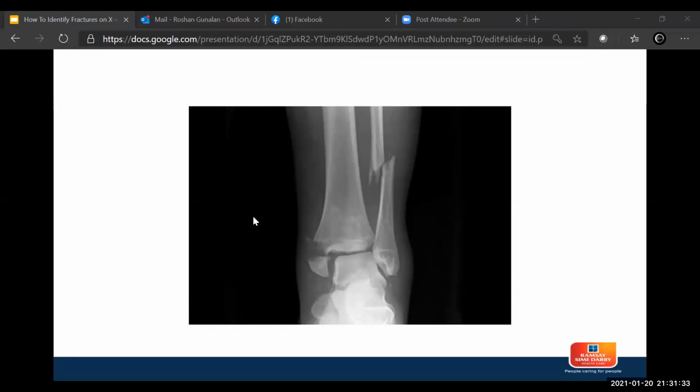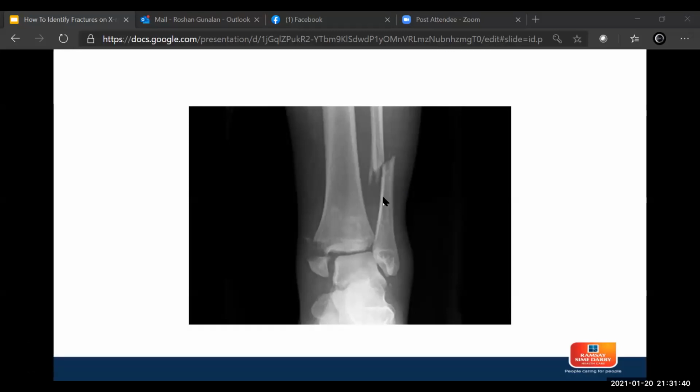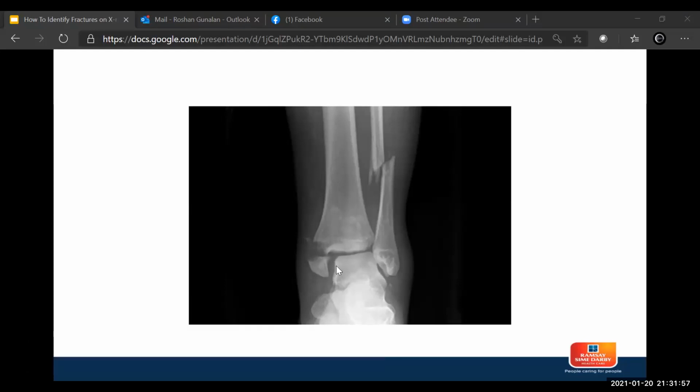Okay, very good. Someone said medial malleolus finally. Okay, so it is. So this is actually an ankle fracture. Somebody said lateral malleolus also. Lateral is here. The medial malleolus is here, and this is the fragment that is well displaced. There's also a fibular fracture at the distal third. The ankle joint is incongruent now, so it's an intra-articular fracture.